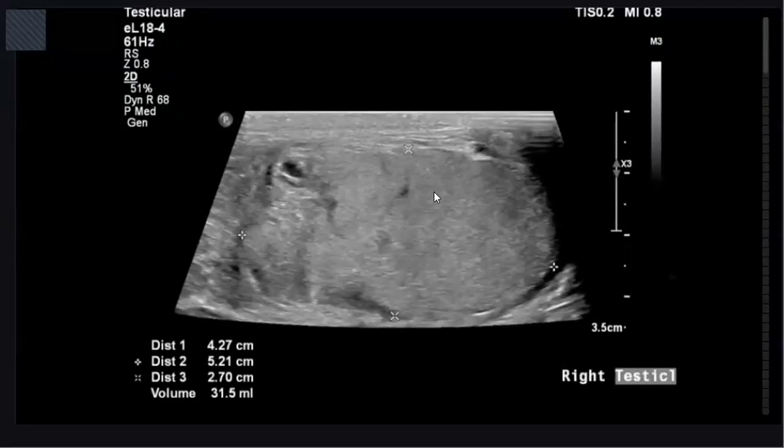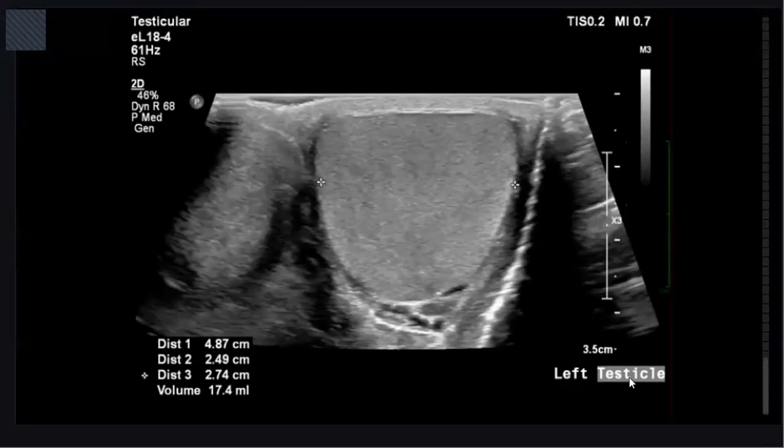Here, I don't know why, you know how to tackle the cases of ultrasound. It's very easy to go through them. Okay, I give you first this one. So here, the left testicle, you can see the volume. It is seen of average size. You can present like this. Here I can see the left testicle. It is well defined, of average size and homogeneous echo pattern.